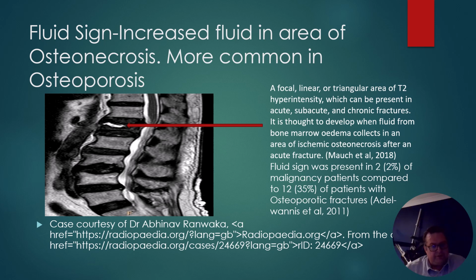We look as well for this fluid sign, which is more common again in osteoporotic patients: 35% of osteoporotic fractures versus 2% of patients with malignancy. This is where it is thought that the fluid from the bone marrow collects in certain areas, and this is what happens here.